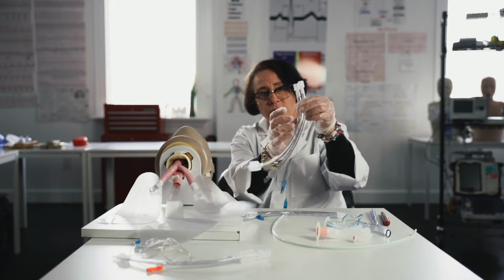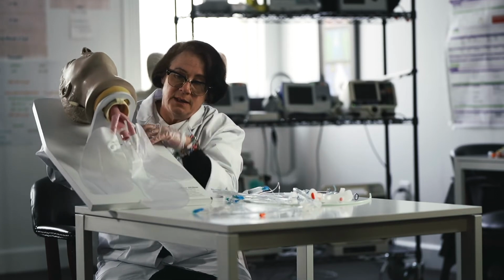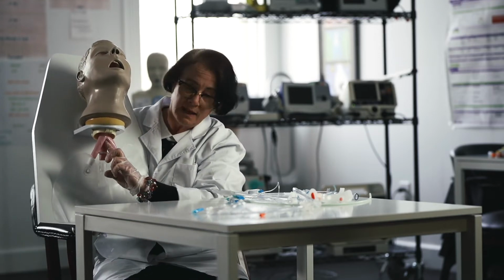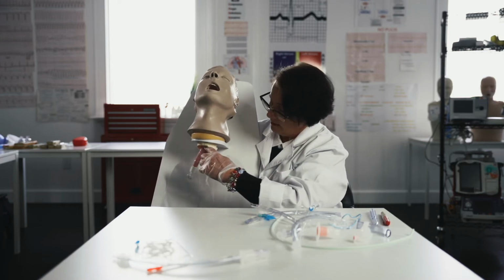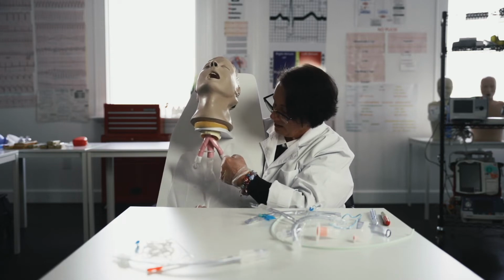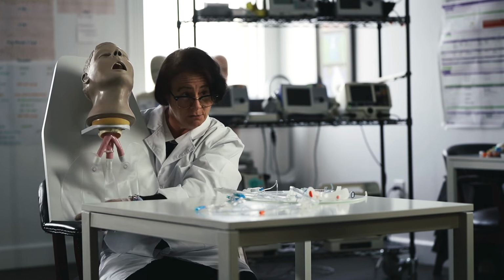As the number gets larger, your tube will get longer and wider. Now, the tip of an endotracheal tube is going to sit deliberately 2 centimeters above the carina. So here's our carina. The tip of that endotracheal tube is going to sit right above it, so that when we give him breaths with the bag valve mask, both lungs inflate, or put him on a mechanical ventilator, both lungs inflate. But I'm going to bring the heart over. The heart's coming for a vacation, so it's coming over here for a second. The heart's actually in the way of the left lobe of the lung. Because the heart's over here, there are 2 lobes on the left, but there's no heart on the right, so there are 3 lobes on the right.